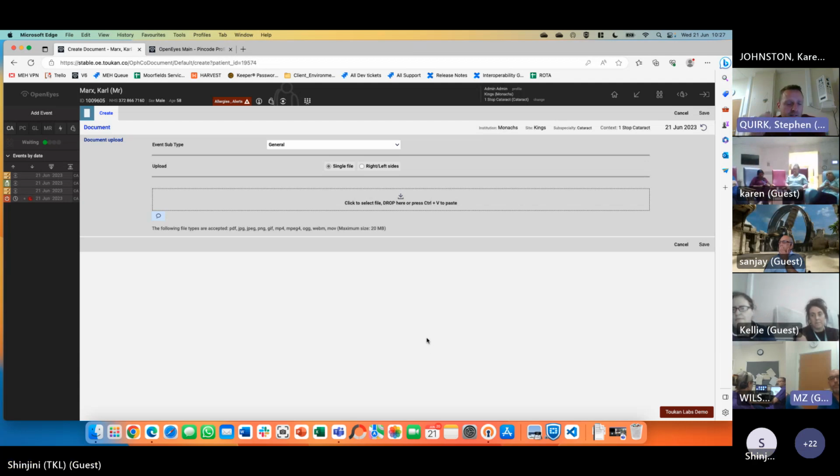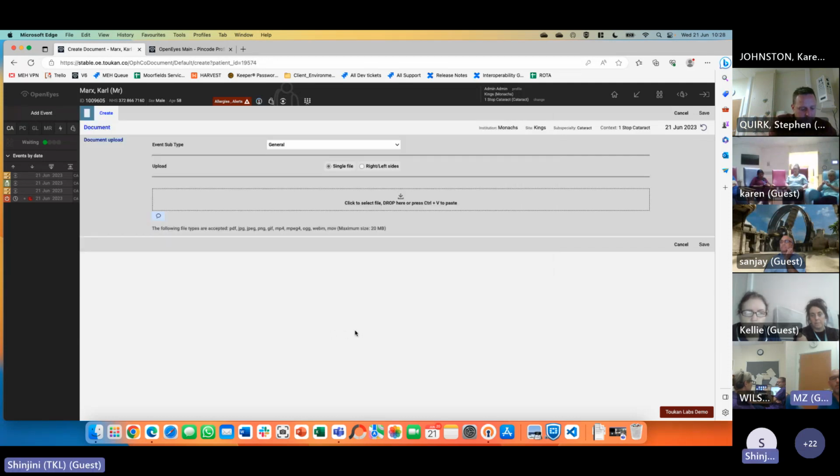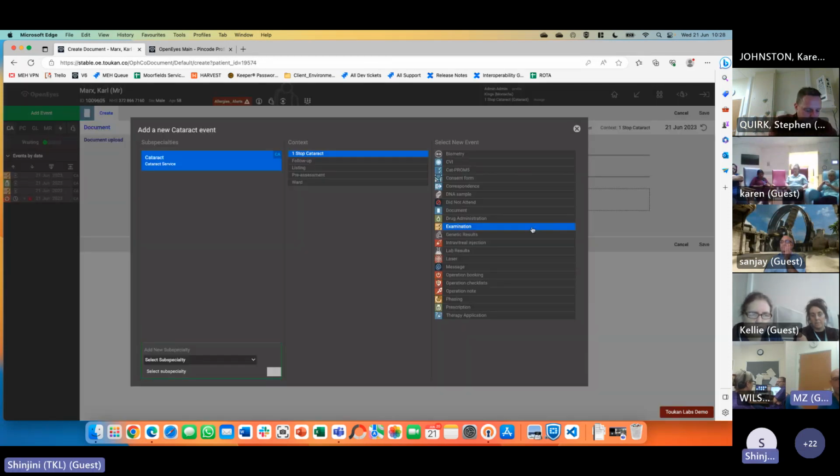Shinjini, on the demographics page, can you add if a patient's diabetic or if they've got glaucoma or if they've got AMD, so you can put almost cohorts onto them? You can add them as diagnoses, yes. But I don't understand. Are you asking if we can add diagnoses into demographics? Well, just so we know what the diabetic population is.